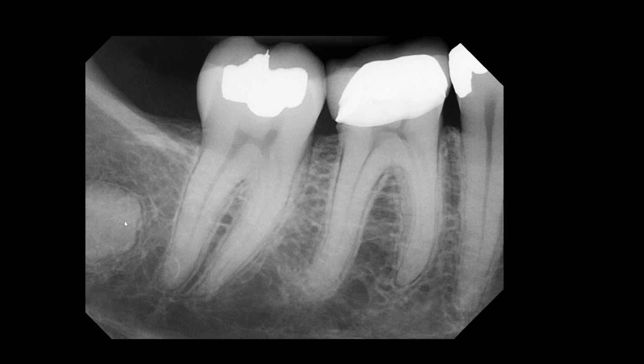That's very important to note before we are too confident with our diagnosis. Because what if this is not localized in the area of 32? What if this opacity extends well into the ramus? That completely changes our differential diagnosis, right? So you can either take another PA of this area to get a complete visualization of this opacity, or take a panoramic radiograph so that you can see it. I think that should be our next radiographic imaging.